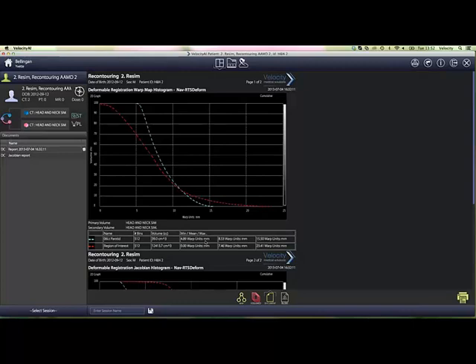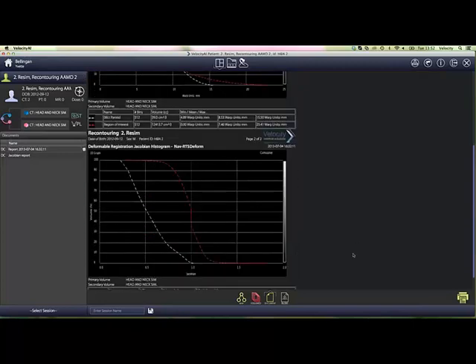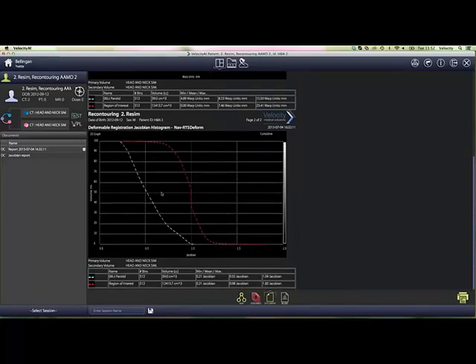Now, if we look at this value in the bottom lower corner, the 0.27 and the 1.98, that gives the size of the region of interest that we used. So if we look at the Jacobian, we had around 0.22. So let's keep it at 0.27. And then we went to about 1.04 was the maximum.